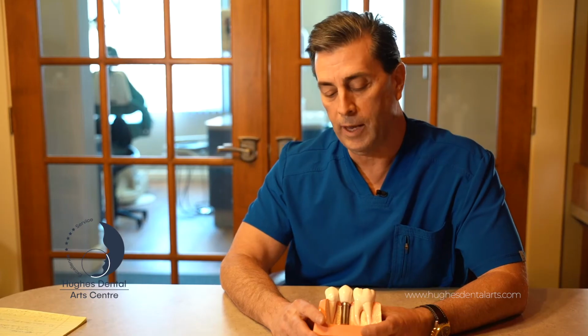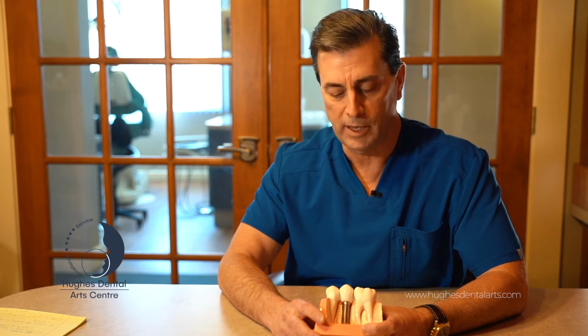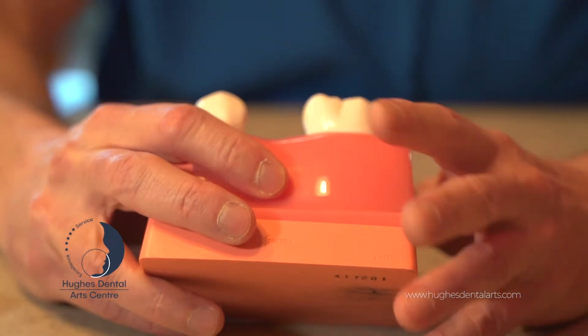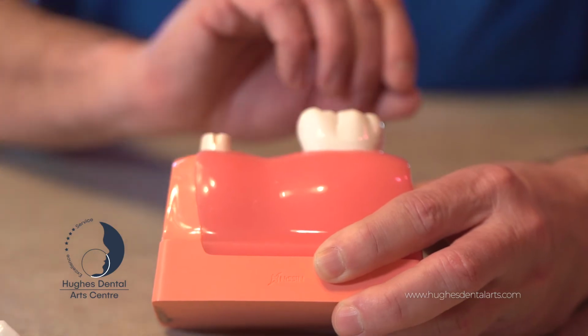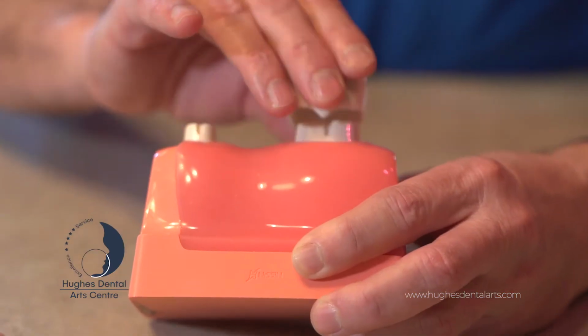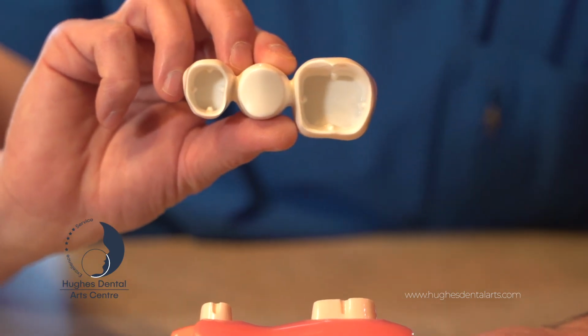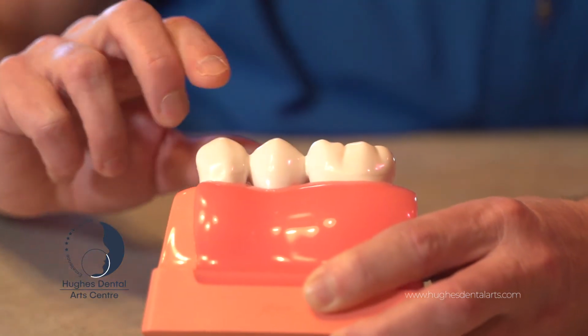Now, one thing that we may want to think about is, what's an advantage of a dental implant in replacing a single tooth? Back in the bad old days, years ago, before dental implants came along, we didn't have a lot of good options for replacing teeth. What we would typically do is make a bridge. For example, if a tooth were missing here, we would reduce and reshape this tooth, and it looks like basically a stump, and we would reduce and reshape this tooth over here. Then what we would make is what's called a bridge, which is basically two crowns here and here with a false tooth that's fused in between. And so that would fit on like this, okay?